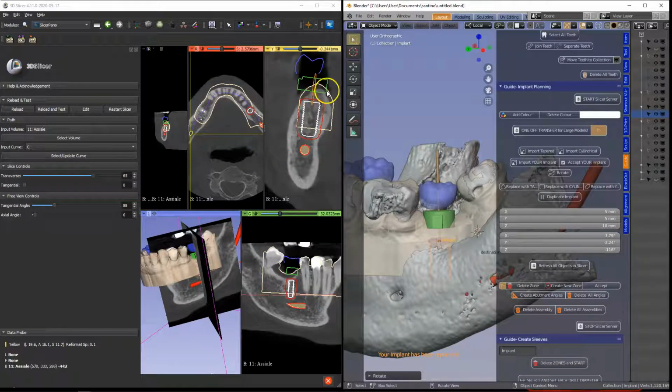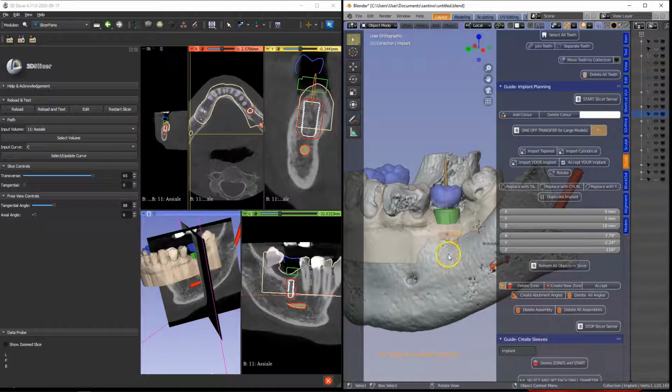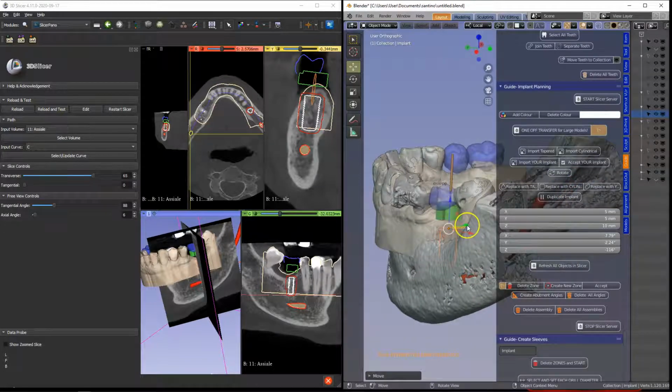We can also see that there's quite a bit of bone on top there as well, which we don't see in this ICP model. The segmentation model doesn't show this. So if we move it up a little bit and across a little bit, this is just about fine-tuning. We have a safety zone over here. Note also that this is our model, this is how the model is shaped. So there's a few things to look out for.